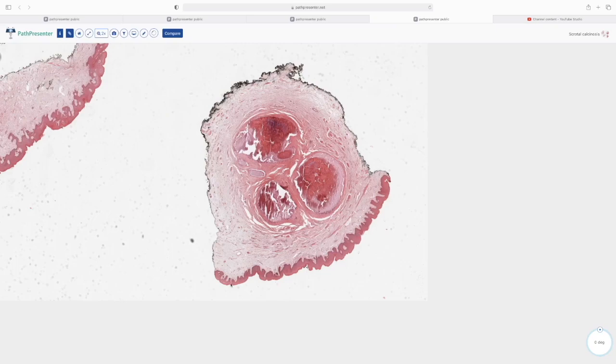And another thing about this epidermis, it is a very corrugated, very thick epidermis, and has a corrugation. So when there is this kind of thick corrugated epithelium with underlying smooth muscle, it is usually erectile tissue. That means it can be the nipple, or the scrotal skin, or the vulvar area. And this lesion is actually classical for the scrotum, and this is called scrotal calcinosis.